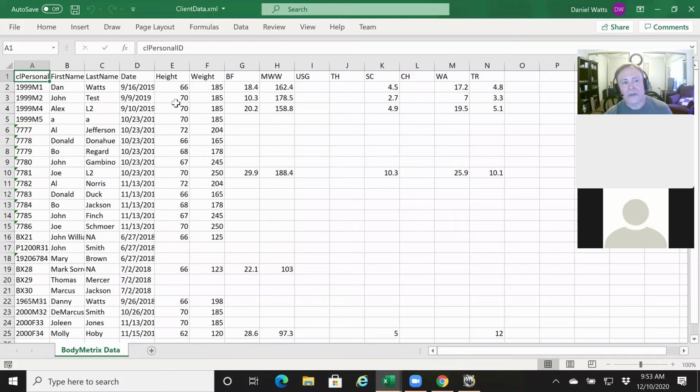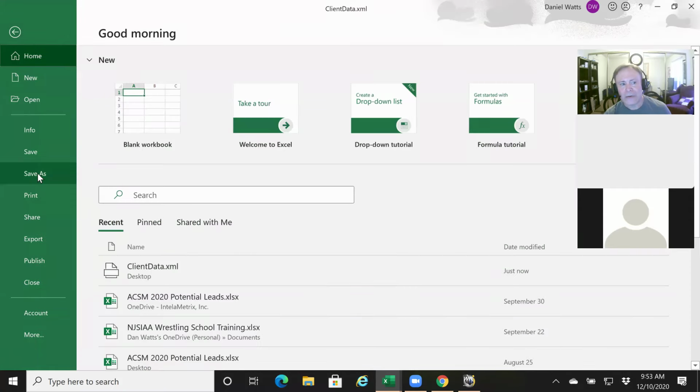Then you've got a working spreadsheet with all your kids, all their info. So you can see the fields up here going horizontally, percent fat, which is what you'll need, and then height and weight, I think. Okay. And you'll plug those into Track. And then it's just File and then Save As, right? However you want to save that doc.